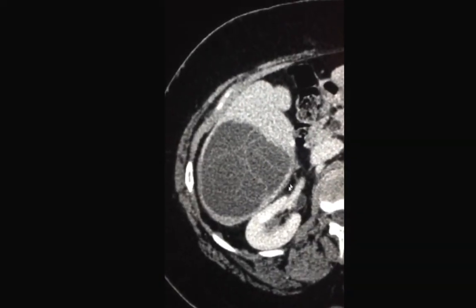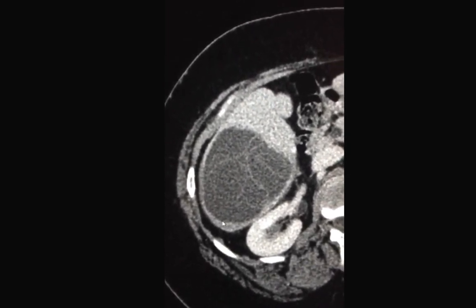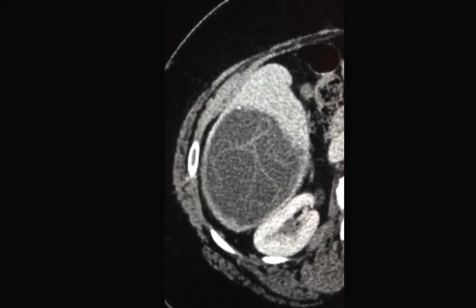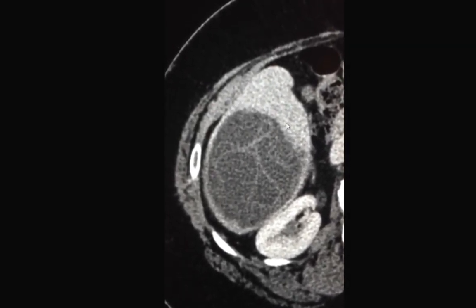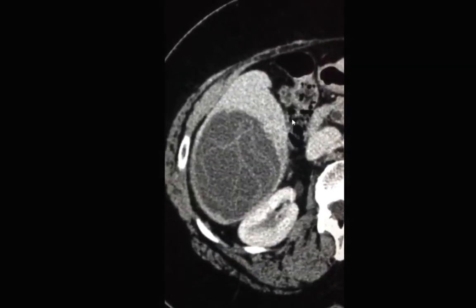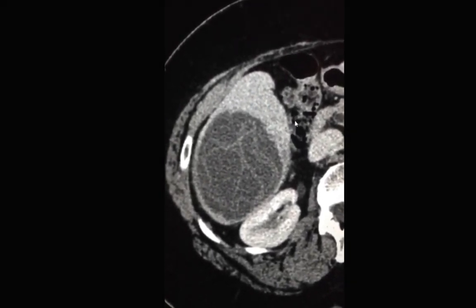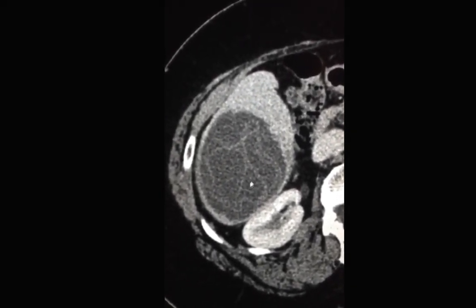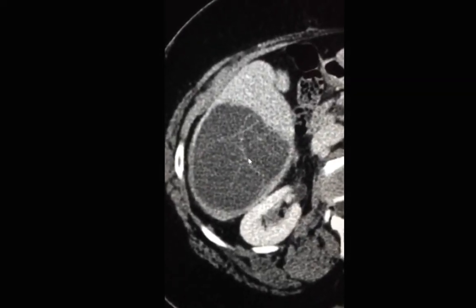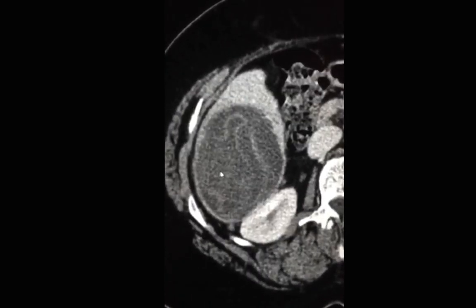There is a large, low-density, well-defined lesion within the right liver lobe. The abnormality has no perceptible wall and does not lead to adjacent inflammatory hepatic changes. In a prior case, we discussed several features of different cystic hepatic lesions. This is one that we did not see before. The distinguishing feature about this abnormality is the presence of this thin undulating internal membrane.